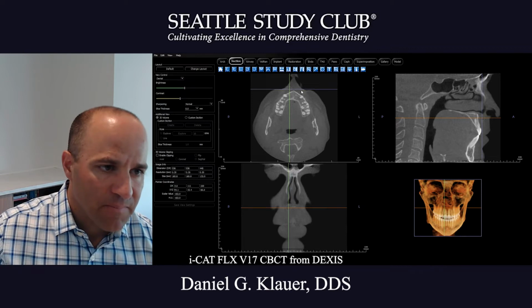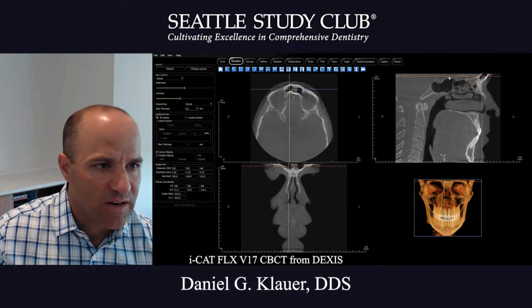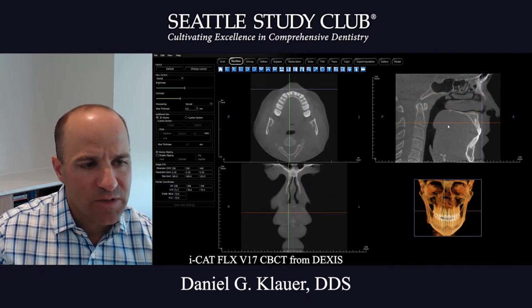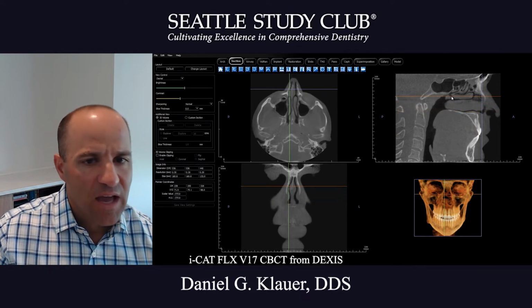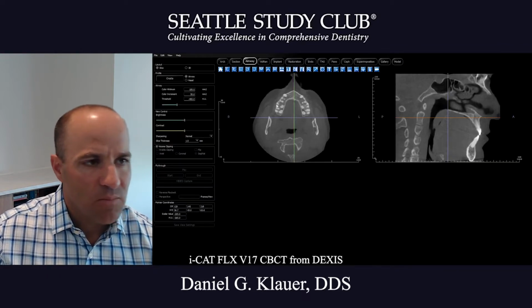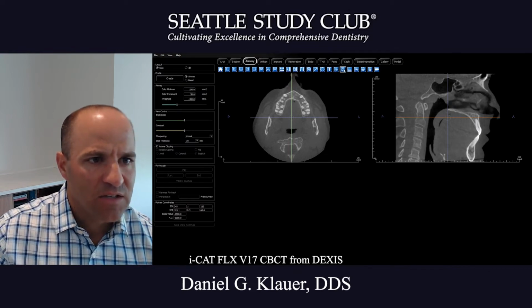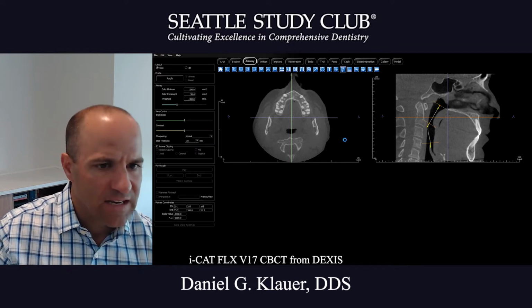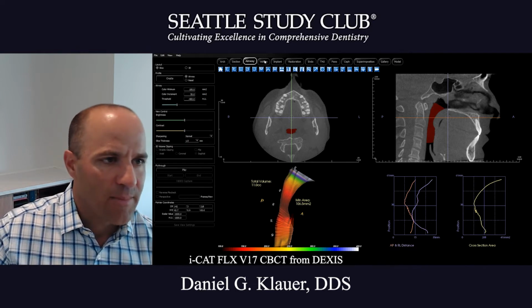And then I just peek at it from all dimensions, looking for gross asymmetries or any abnormalities that jump out at me that have me concerned. Look for regions in the external and internal carotid arteries for any calcifications, and just make note of those. We do look at the airway feature, not diagnostic by any means, but it at least helps us to see, okay, what does the anatomy look like? And so we can map that out and take that for what it's worth, as we know it's upright, awake, but then we can comment on that.